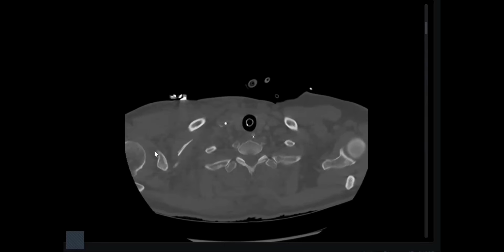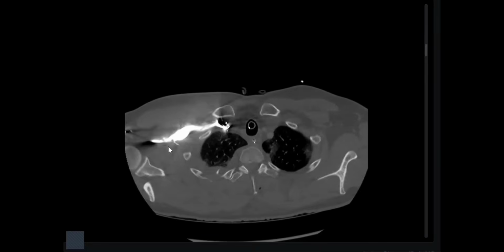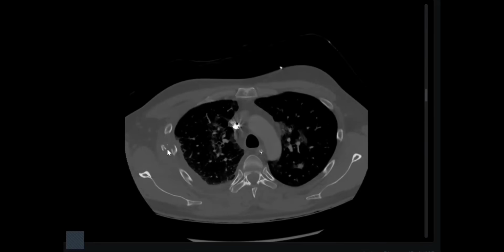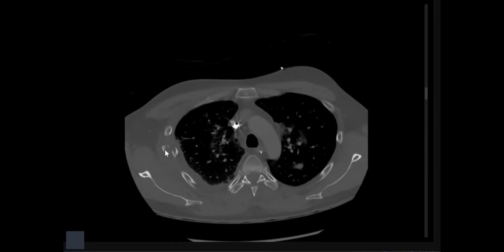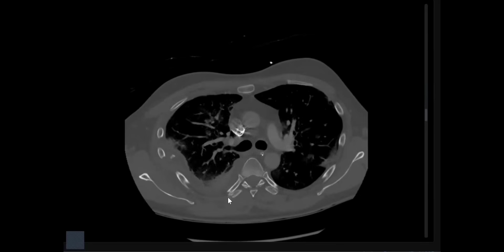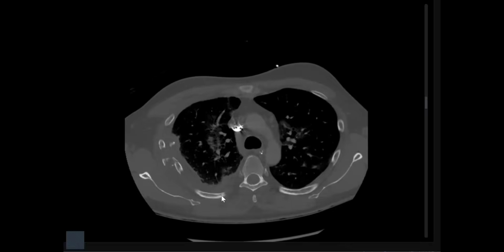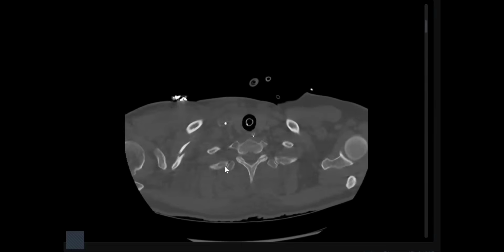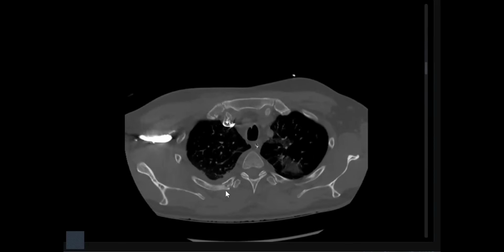Okay, my friend, you missed a major finding here. You ignored the clavicle, but there is a lateral rib fracture, displaced, and some effusion. It's multi-level. In such a case, you should assess the posterior ribs and the lateral ribs. It's grossly evident. Let's see the posterior ribs from up down, from even the first. From the second rib, I have a fracture. And the third, fracture.